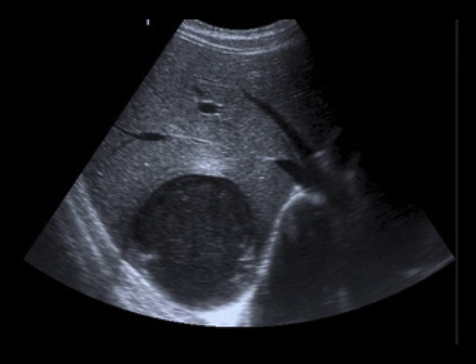On further questioning, the medical student has just returned from India about 3 weeks ago, where he was involved in a medical mission trip. While he was there, he did have a few days of diarrhea. This is an example of an amoebic liver abscess. It's the most common extraintestinal manifestation of amoebiasis and is one mimic of acute cholecystitis.